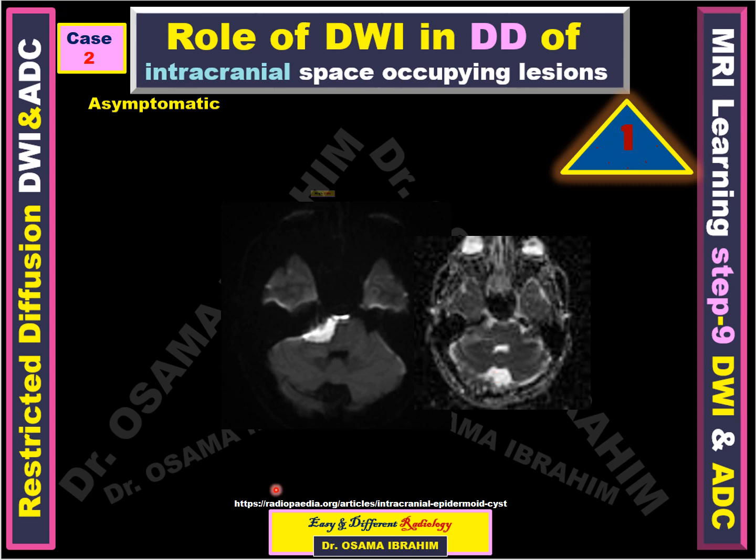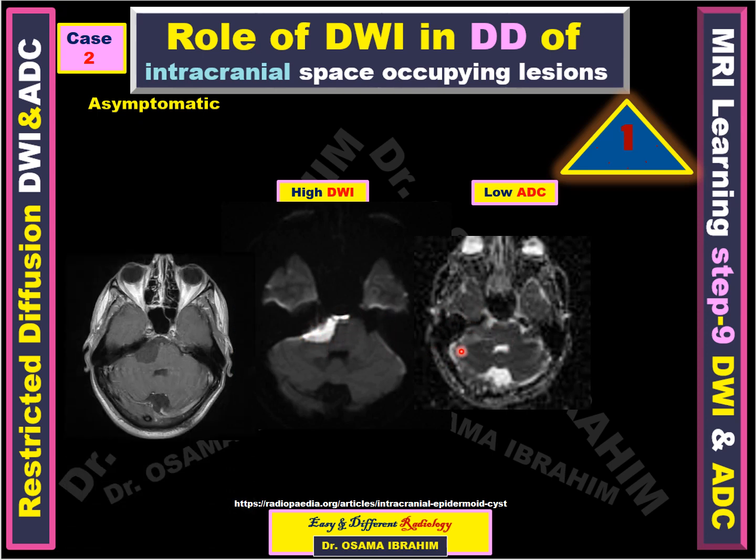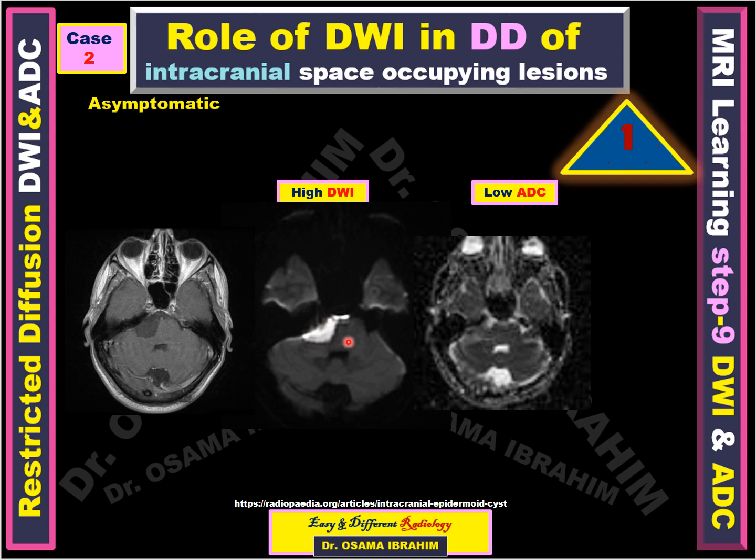Yes, there are, because this is a diffusion weighted image which is showing a high signal in diffusion and low signal in the ADC. So there are restricted diffusions at the cerebellopontine angle lesion. Cerebellopontine angle lesions here, this is the most common site for the cysts like epidermoids or arachnoids or the other schwannomas or meningioma.